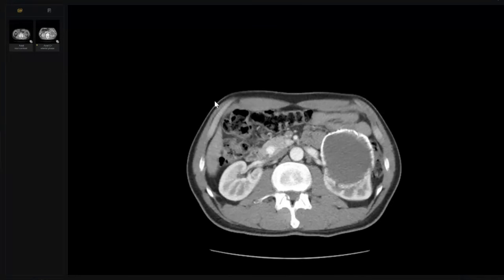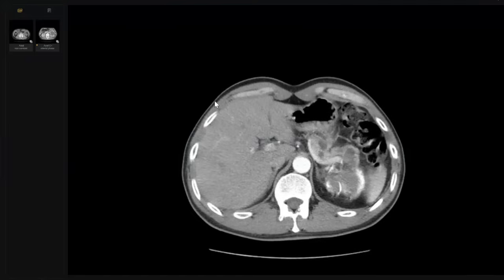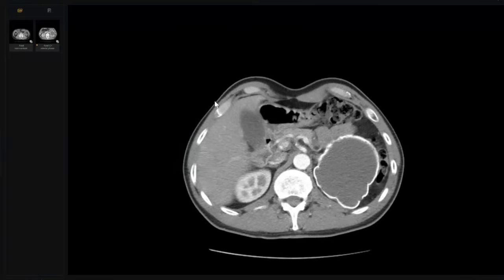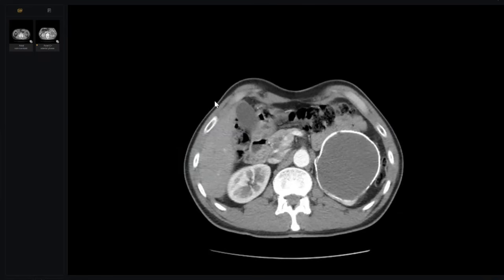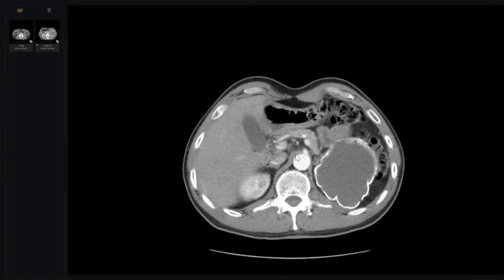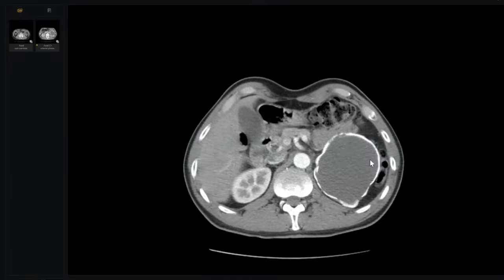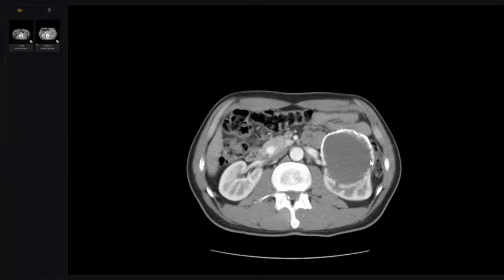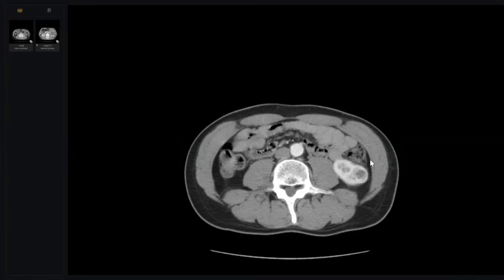My advice for all of you, please don't shift from the CT to MRI or even from X-ray to CT before you smash and squeeze the exam, and at least you must pick up 90% of the findings. Why? If you go to the MRI only to check if there is mural thickness or mural nodule here, it is very, very difficult for you to find other lesions.